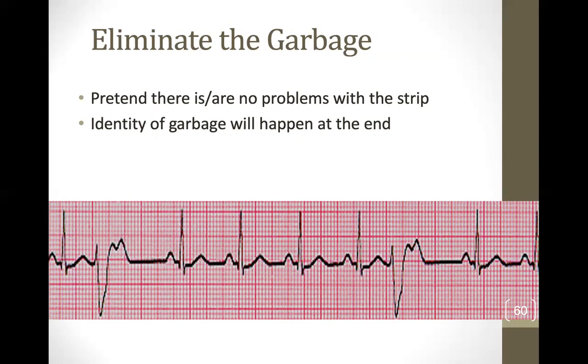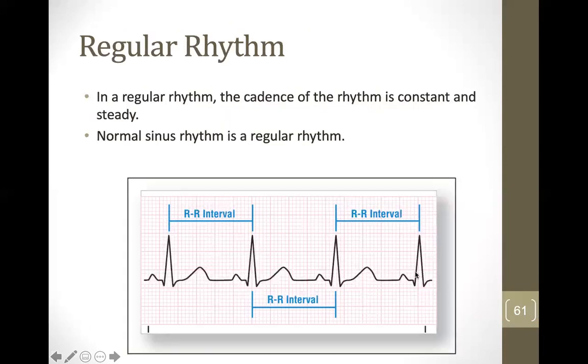My husband likes to refer to it as cutting out the crap. It's like, this is just weird. We're going to deal with that later. And instead, just be taking a look at what is this rhythm that's happening underneath here when we get rid of this garbage that we can see.